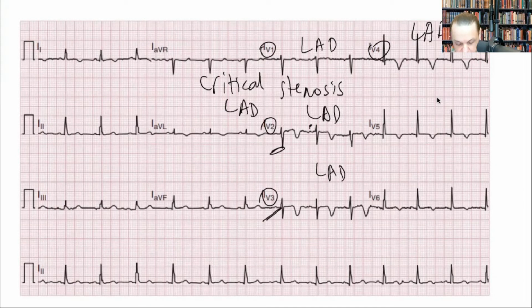And patients with these Wellens syndromes should be transported to the cath lab capable facility, right? And they say the ECG may normalize, but you could still see this pattern when they're pain-free, right? So if you see these biphasic T waves on a person who had an unstable angina or had a complaint of chest pain, be worrisome of critical LAD stenosis.